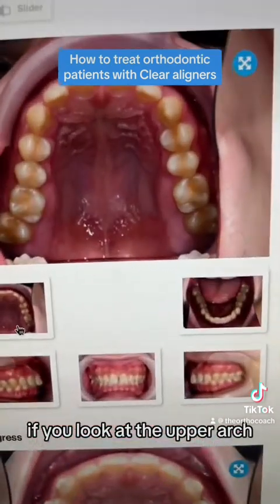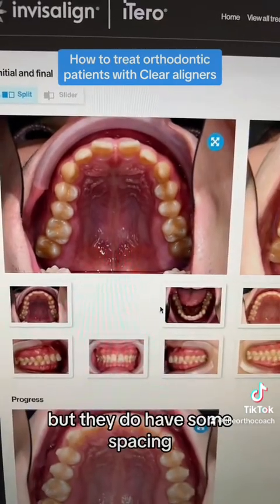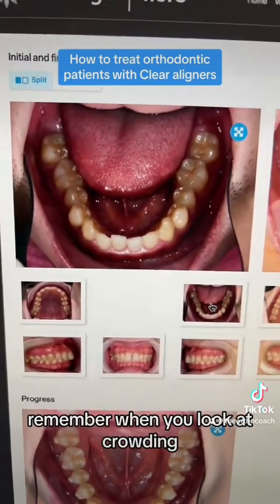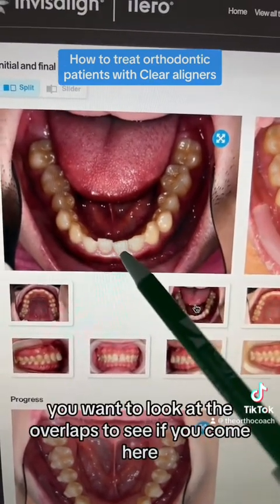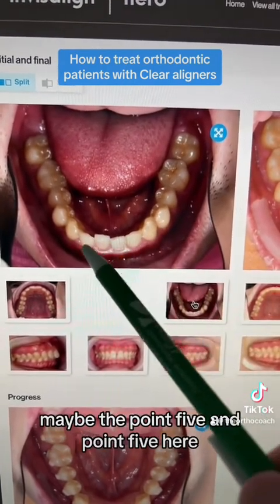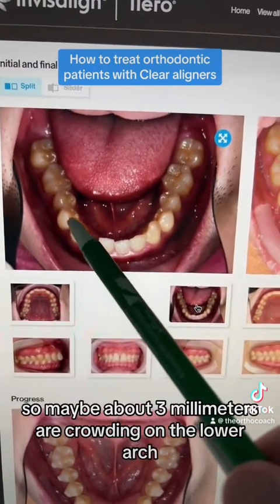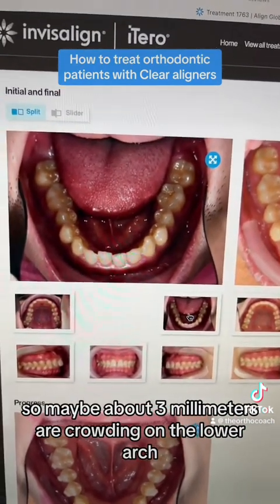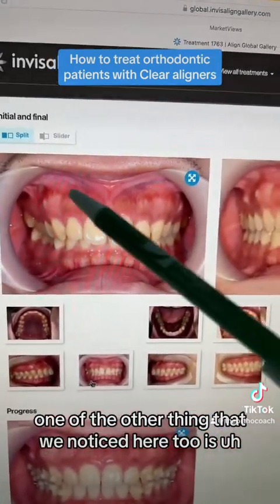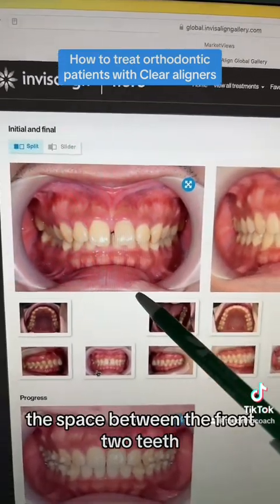If you look at the upper arch, they have some rotations, no crowding on the upper arch, but they do have some spacing. If you look at the lower arch, they do have some crowding. Remember, when you look at crowding, you want to look at the overlaps. If you come here, maybe you see like 1 millimeter of crowding there, maybe 0.5 and 0.5 here, so that's maybe 2 millimeters. So maybe about 3 millimeters of crowding on the lower arch. Upper arch had spacing. One of the other things that we notice here too is this really strong frenum, and this patient does have a diastema, this space between the front two teeth.